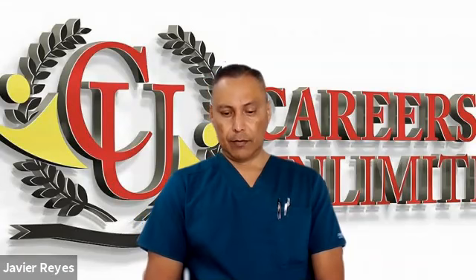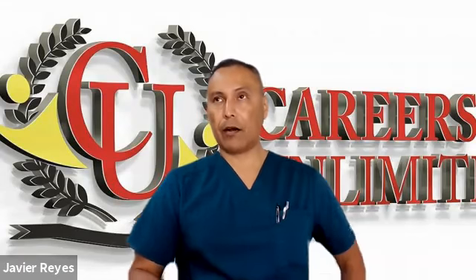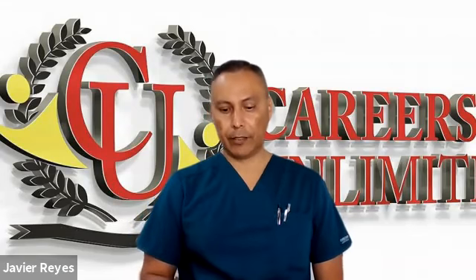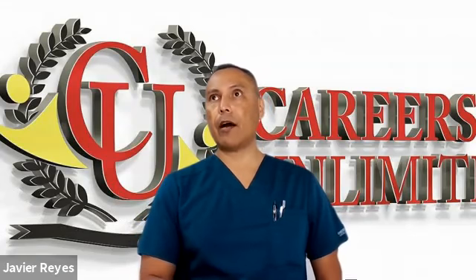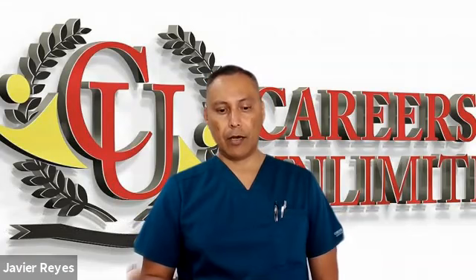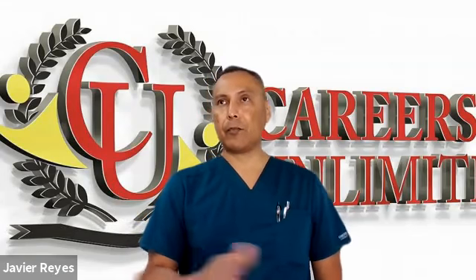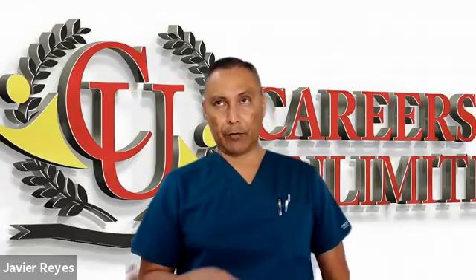Because all the QRSs are pointing upwards, okay? And you get the RSR wave. Although this one looks a bit different than the other ones, it's still R, goes up, comes back down, S, and then R again. So you have RSR. So this is rabbit ears. It kind of looks like the opposite of the other ones that we've seen. The small one is on the left side, and this one seems to be on the right, but it's still a right bundle branch block.